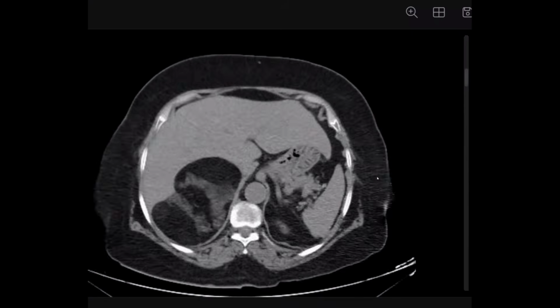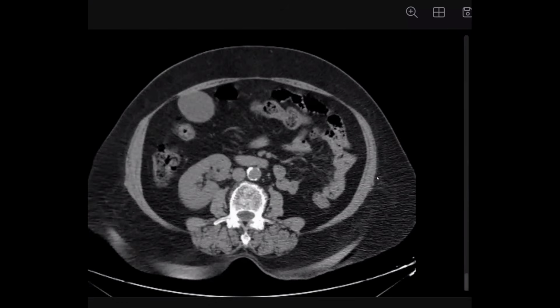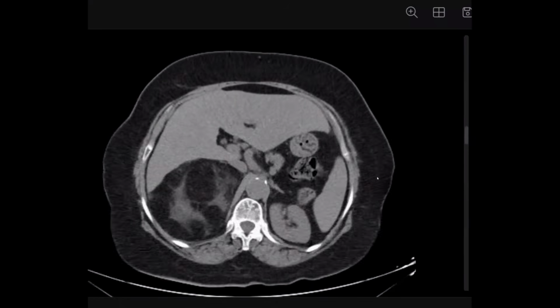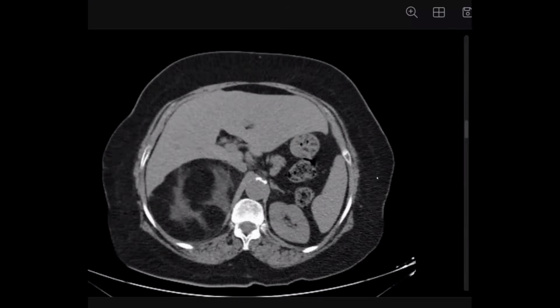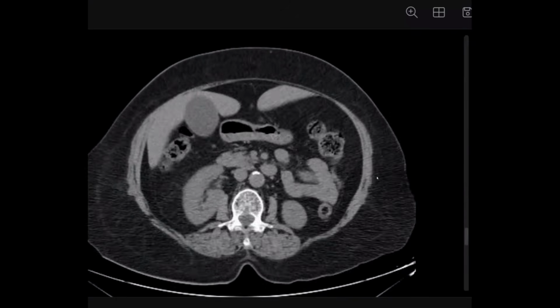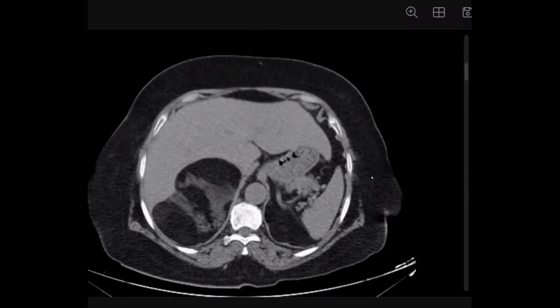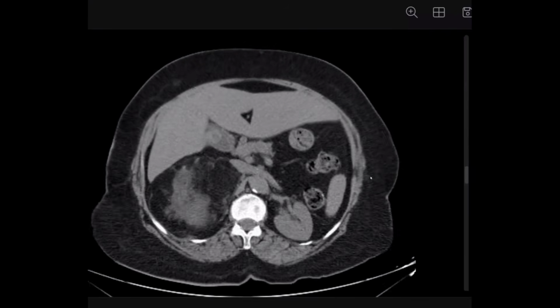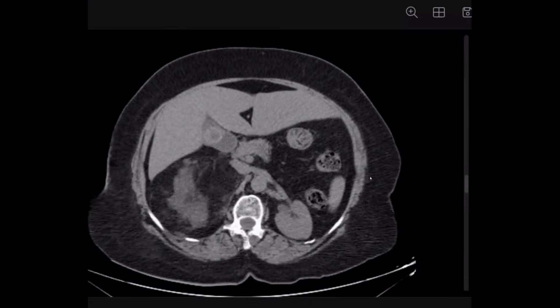This patient was complaining of right hypochondrial pain. I'm provided with the CT abdomen plain images, in which I can appreciate that there is a stone in the gallbladder. Now, as I'm going down, I can appreciate there is a fat density lesion in the suprarenal location of the right suprarenal region with an internal soft tissue component. The right kidney is displaced inferiorly. The left kidney appears unremarkable.